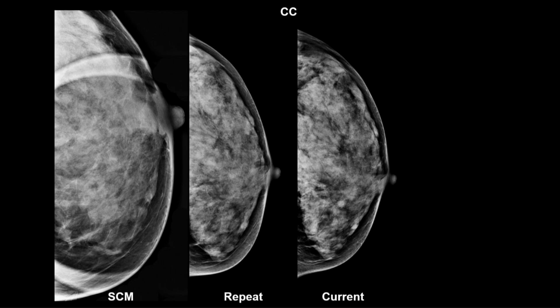These two in combination give you a dual opportunity to see a real finding and give you the other opposite opportunity to be confident that there is no finding there if you don't see anything.